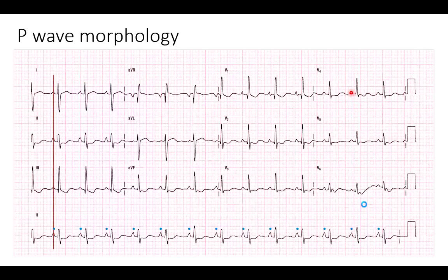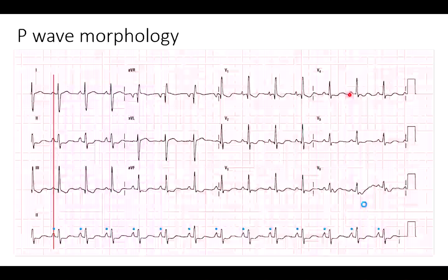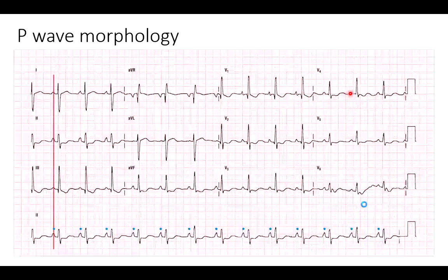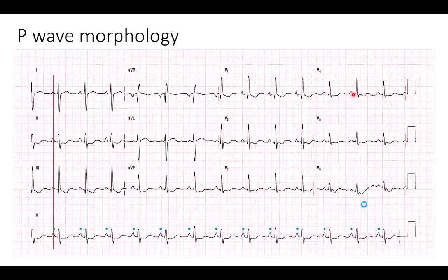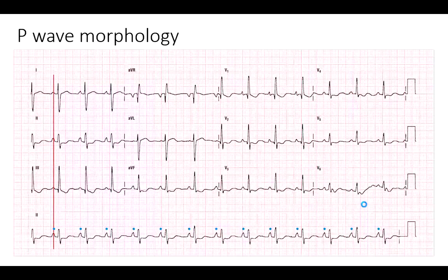And then I look down and I go, oh, there it is. Well, it's there. That lead just didn't pick it up. Or that lead has poor conduction, the skin wasn't prepped properly, or that lead is in the wrong position, not able to see the electrical impulse activity from the atria.